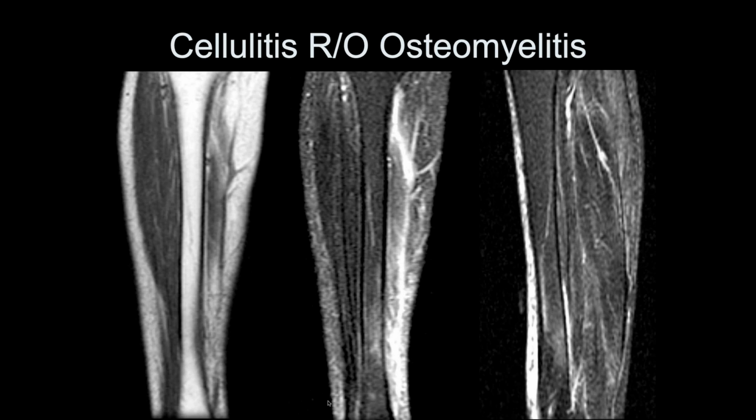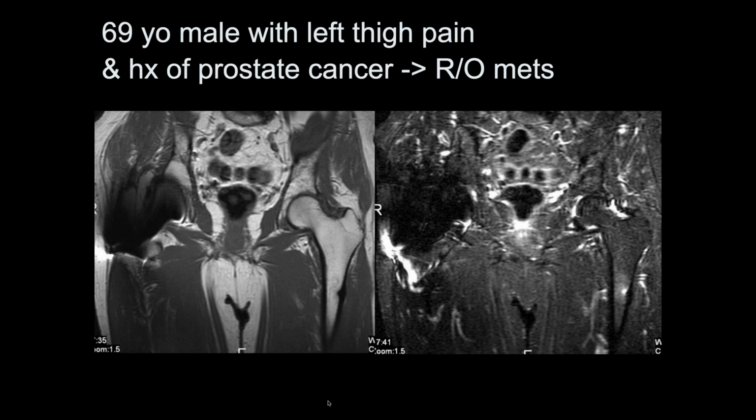Does the hip area on that fellow with a stress fracture, not on this view, but the next one, is that a total hip replacement? On the right it is, yes. Oh, what the hell is he doing getting a stress fracture?